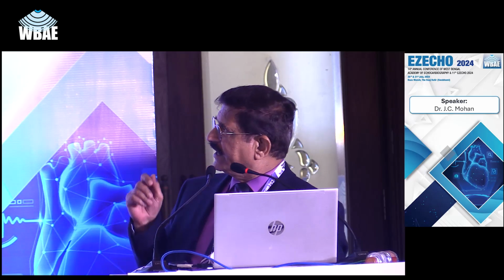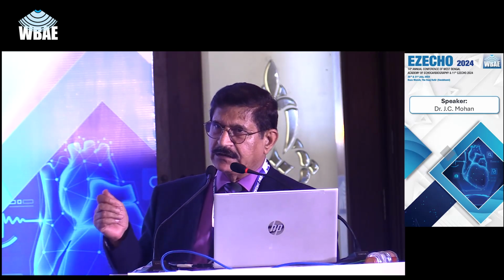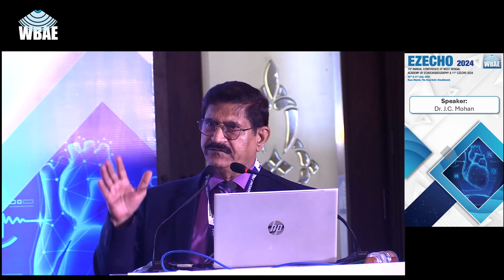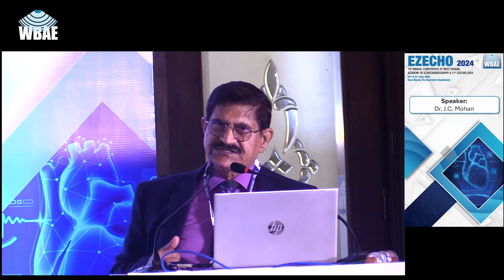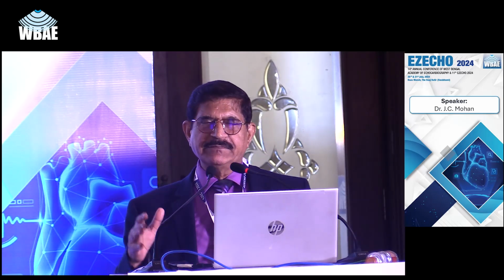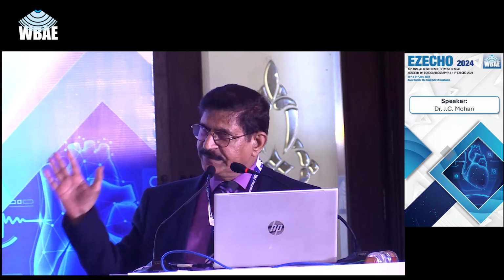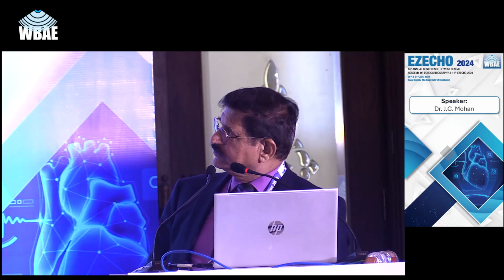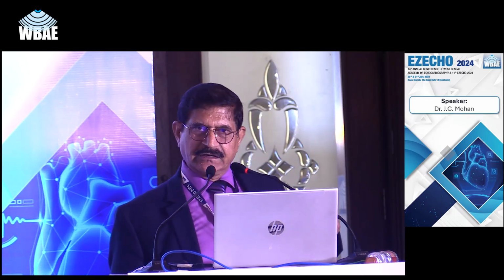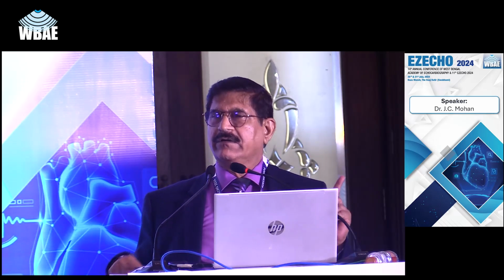Now we focus on the right ventricle. You see the ace of spade appearance of the right ventricle. The right ventricle shows free wall hypertrophy, septal hypertrophy, and apical hypertrophy. In this patient where the contrast has been given, the studies have been conducted by my colleague Dr. Madhu Shukla. I had no role to play in that. Beautiful pictures, and you see that there is actually ace of spade appearance of the right ventricle, and you would say, okay, that is biventricular hypertrophic cardiomyopathy, right, so far?